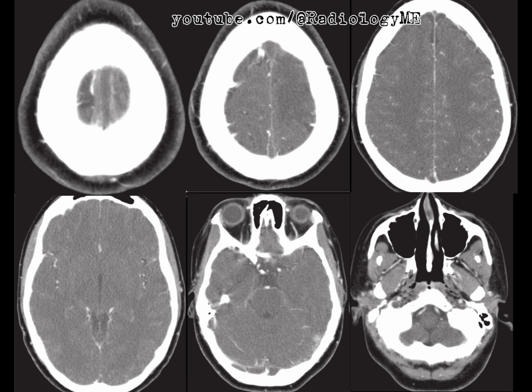When talking about dural sinus thrombosis, DST, several anticipated questions could come up. One question that might be asked could be, what are the early imaging signs on non-contrast CT? Here, it would be critical to mention looking for hyperattenuation in the dural venous sinuses, the so-called cord sign or areas of venous infarction. You could also be asked about other imaging modalities, such as MRI, where you'd look for changes in the T2 signal, or the classic empty delta sign on MR venography.